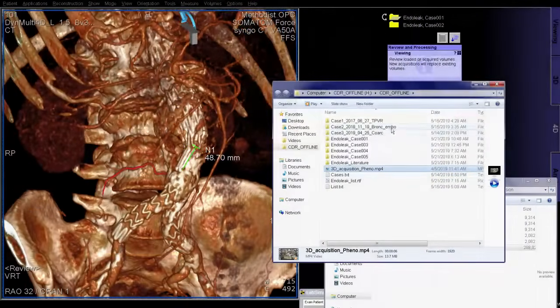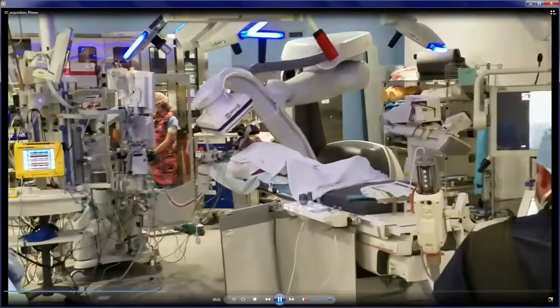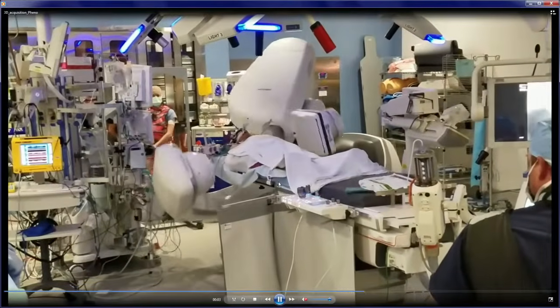Okay, now we are going to take a virtual visit to the operating room. So this is our diagnostic imaging computer where we reviewed our scans. Instead of taking you all to the operating room, this is essentially the same computer that is connected to the C-arm where these images are acquired. What we typically do in the operating room is go through a process of 3D acquisition or 2D-3D registration to integrate this. So this is a typical view of our hybrid operating room.